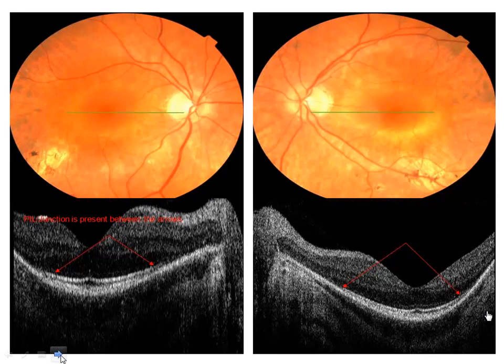Here's a patient with 20/15 acuity. He happens to be an attorney, and he came in with a chief complaint of difficulty playing ping pong. He used to be great, and now he says he's getting really bad. He doesn't understand it. Well, we look at his fundus and we say it doesn't look quite perfect. Maybe there's some thinning here. Maybe some subtle pigmentary changes.